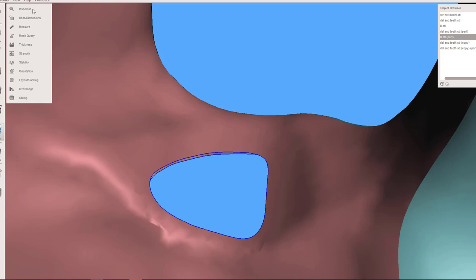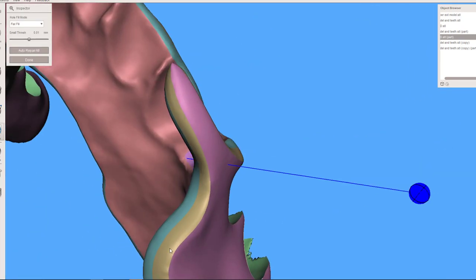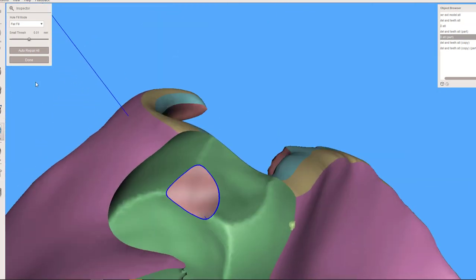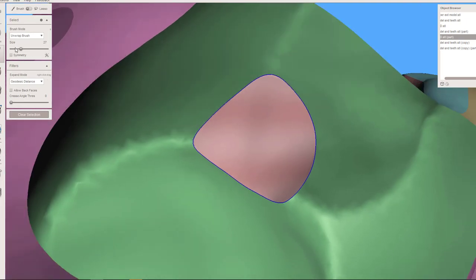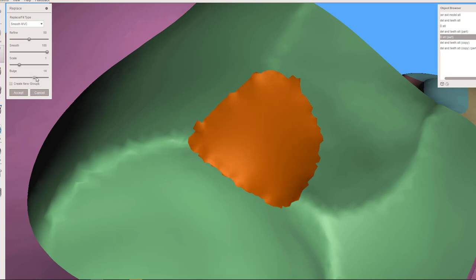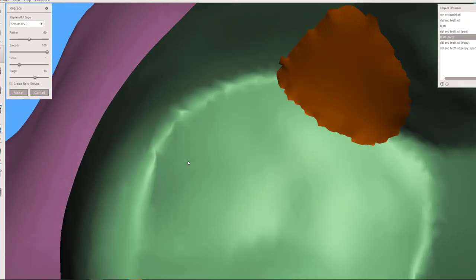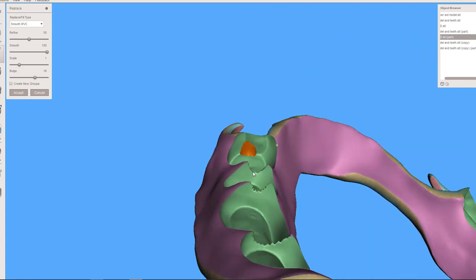Okay, so I could either do analysis, inspector, and just fill that, and you see it fills across. Or alternatively, if you've still got this thing open, you could just select the boundary, F for erase and fill, and now you've got a little more control over what's called the bulge, like how concave or convex does it need to be, okay? And maybe that affects fit a tiny bit.